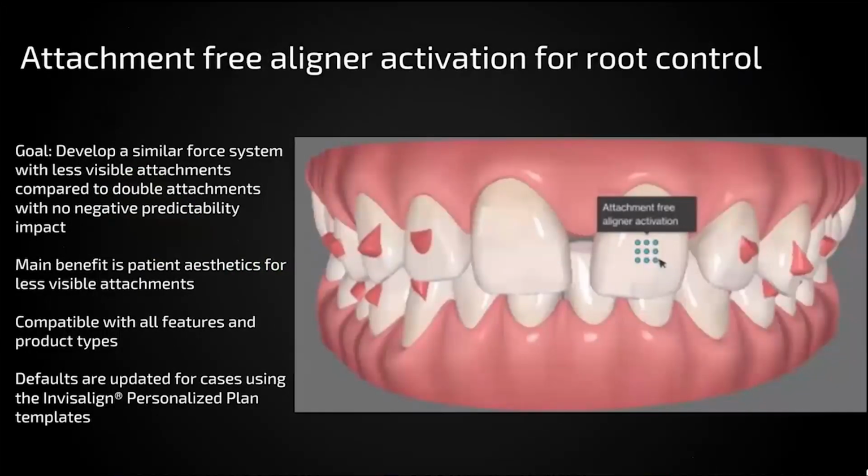Let's talk about Invisalign first. Let's try to find out what's possible, what new features are in the software and how we use them, and if you really can use them for all your treatments.